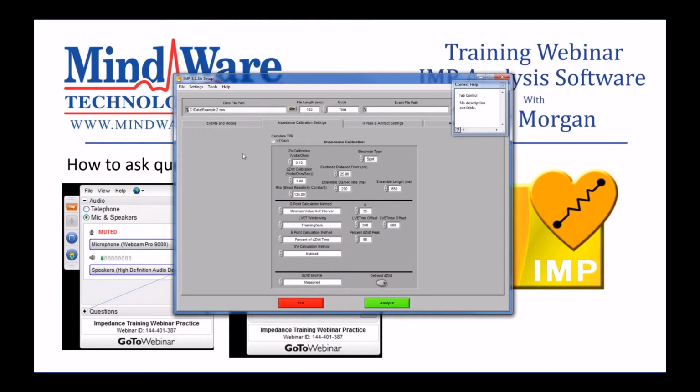You start there, and then if you find that your B point is regularly being mismarked due to certain physiologic components of your population, you can always come in here and make adjustments to the B point algorithm as you see fit.